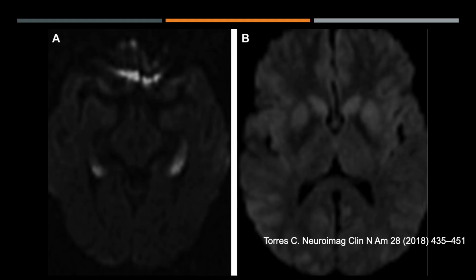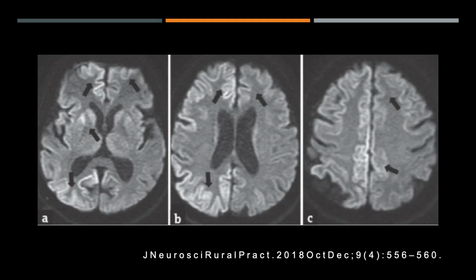And it can be from hypoxia. This is one from hypoglycemia. Again, the structures that are most metabolically active, deep nuclei and cortex, are the ones most involved. The imaging appearance at first looks quite similar on this diagnosis, except this would be a patient with progressive decline over days and weeks, and presents with dementia and confusion, may even be an outpatient. This is restricted diffusion in cortex and basal ganglia and patchy regions, and this is CJD.